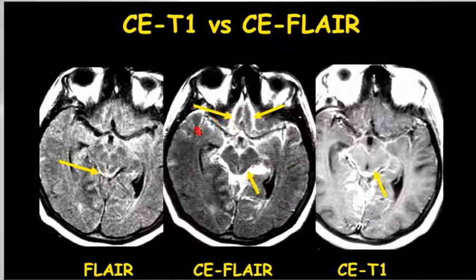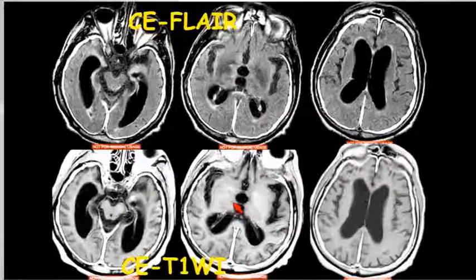One is that the T2 FLAIR, when you think about it, really has a number of different contrast mechanisms. It's nominally T2 weighted. It's also fluid suppressed, but it has characteristics to give you bright signal when there's very bright T2 species, but also there's some T1 shortening which can shine through, particularly in your 3 Tesla scans. So complex mechanisms of tissue contrast, but the intravenous gadolinium contrast does show up bright in the leptomeninges and also bright for most intraaxial lesions, as it turns out, things like tumors.